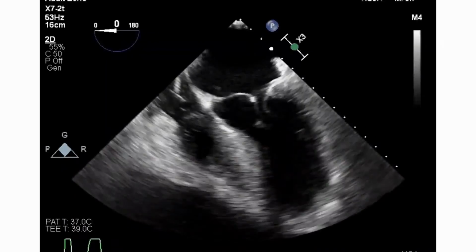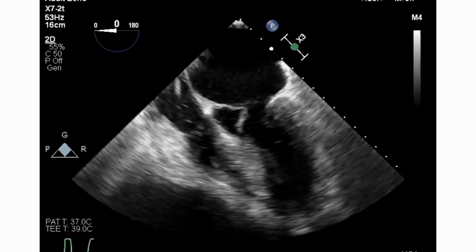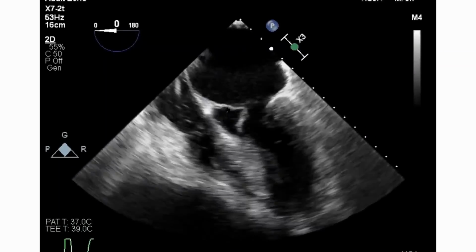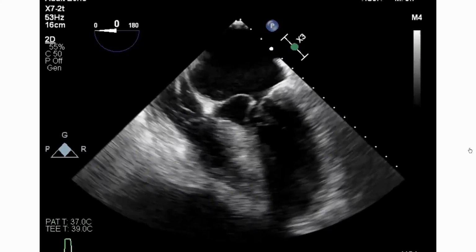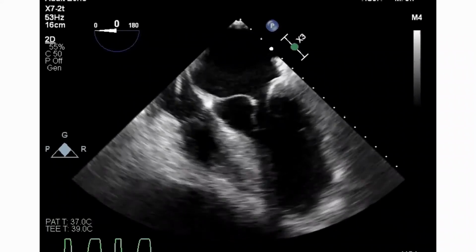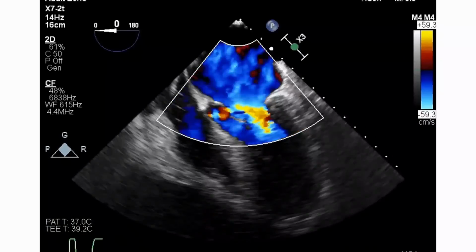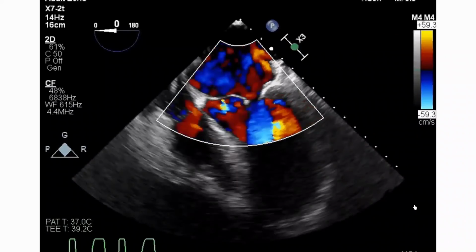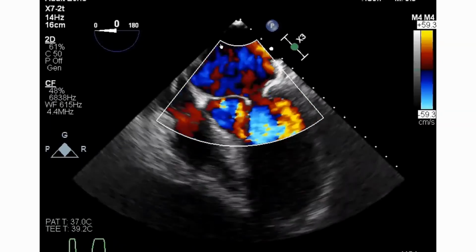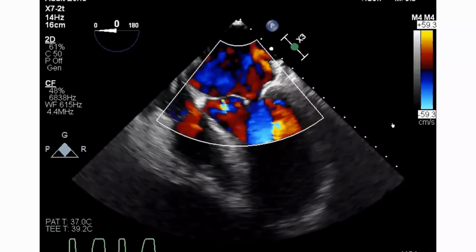And then a TOE was done, and it showed very severe SAM. So there's the myomectomy there. It's difficult to see the mitral repair patch. This wasn't done by me. I'm not saying that for any reason. Again, this was the appearance. So it was interpreted as severe MR circulating around.